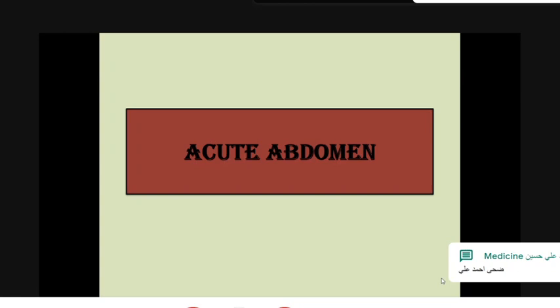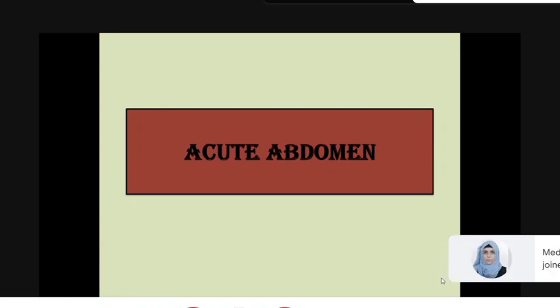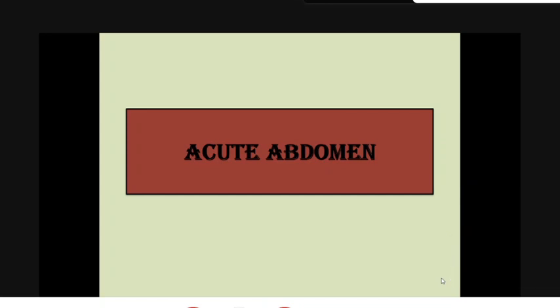There are many reasons for using chest X-ray as a tool for investigation of acute abdomen. First, the erect chest film is the best radiograph for showing the presence of a small pneumoperitoneum, particularly on the right side between the liver and the diaphragm. It is superior to the erect abdominal film for this purpose.